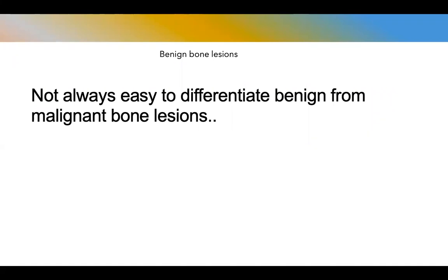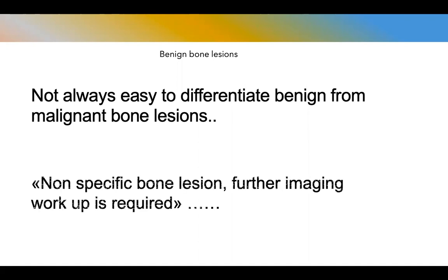It's not always easy to differentiate benign from malignant bone lesions, and that's why many reports end with the sentence, non-specific bone lesion. Further imaging workup is required.